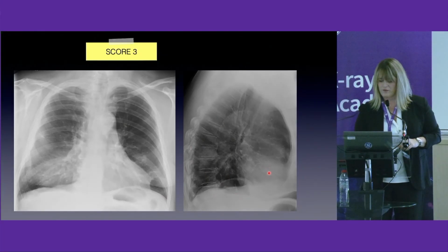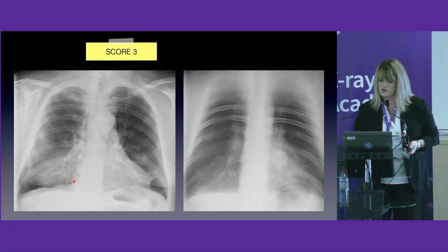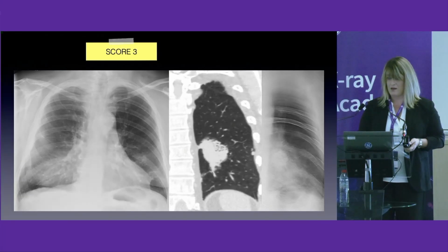So we perform DTS, but take a look at what we found. Those ones are just pericardial fat. So not a lesion, but what we can see is this lesion. This was confirmed by CT scan. Yes. We were very lucky.